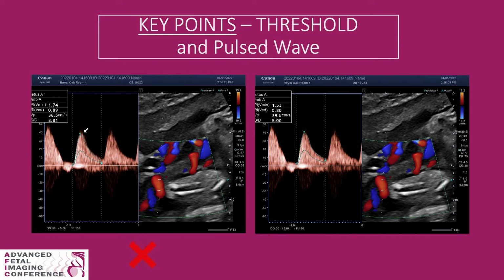Expanding on pulse wave Doppler optimization, let's talk about threshold. I want you all to have a quick glance at these two images. Look at the image on the left, look at the image on the right. Let's see what differences, if any, you can identify before I show you the next slide. I'm going to give you guys 10 seconds to do so.